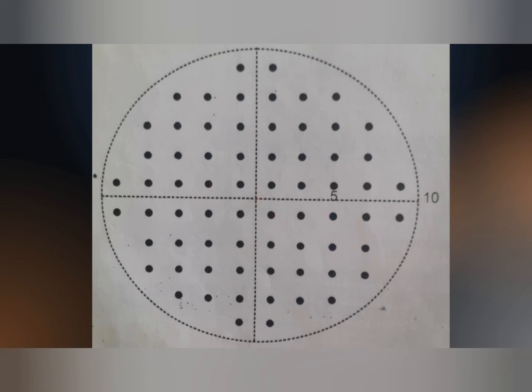Okay. So it means that this 10-2 can measure the visual field defect more accurately than 24-2 and 30-2. So if we find some type of visual field defect or an advanced glaucomatous field defect, we definitely go for 10-2 to see the extent of that field defect, how much depth it has.